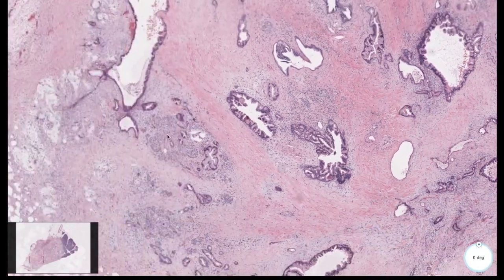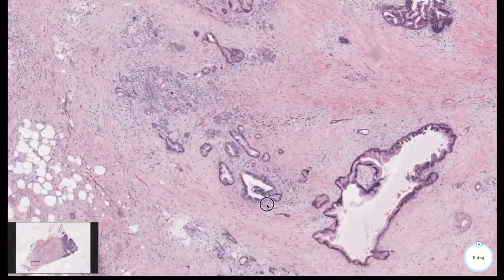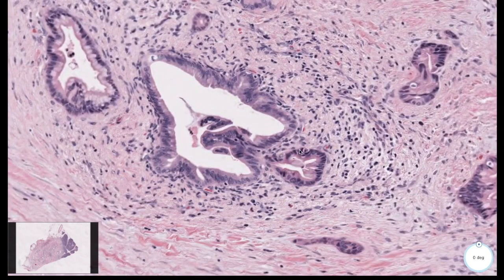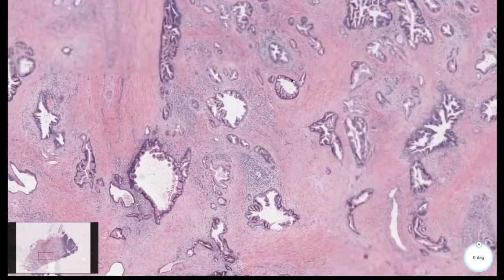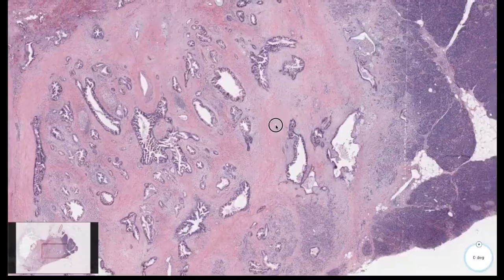And we can keep looking at it more and more, but overall, we're seeing a lot of tiny ductal epithelial glands, for example, this one over here and this one over here. They're just all invading this fibrous stroma. So that is a big no-no.